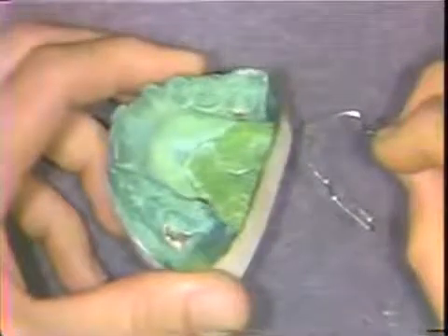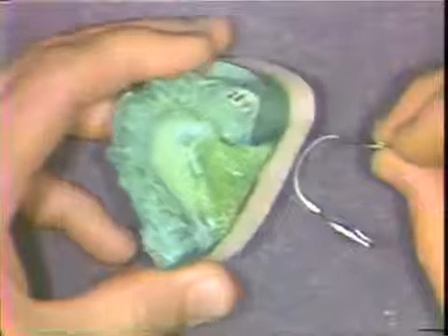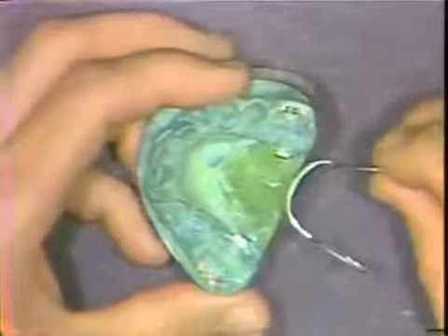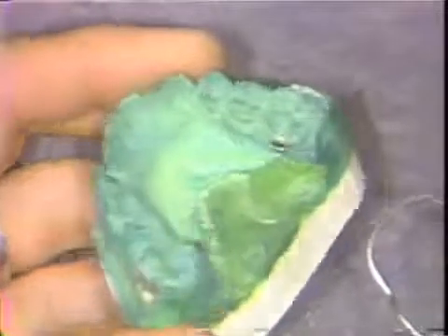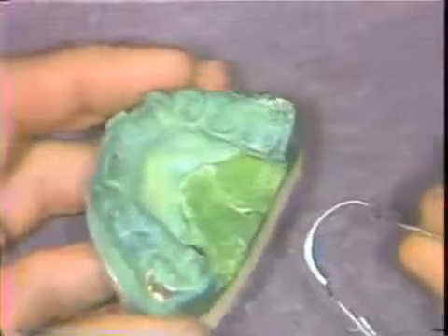The main purposes of the appliance consist of fixing the upper or lower first molar teeth as a unit. It may be beneficial to look at several slides first off, in order to see just exactly where we're starting from and where we're going.